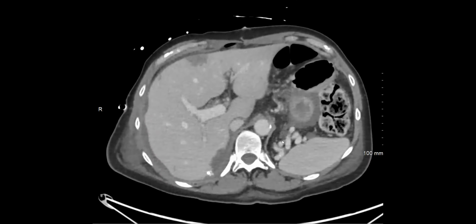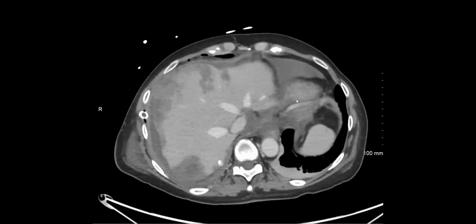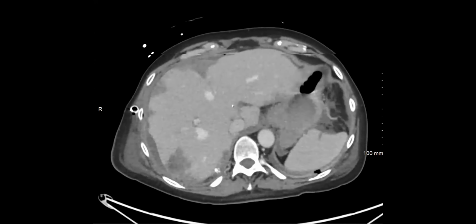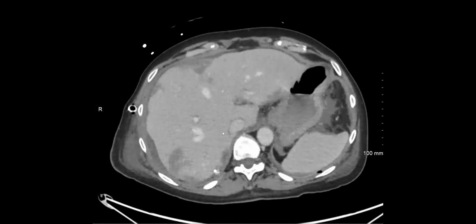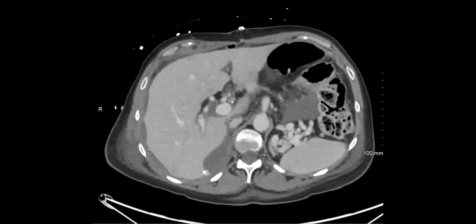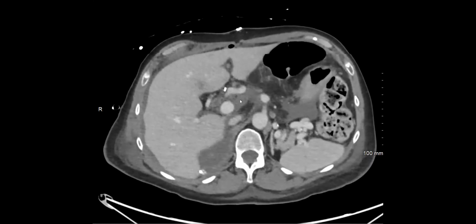So I don't know if it was just ischemia during surgery. I've never seen this extend from just ischemia during surgery. I would expect that there was some sort of embolic event happening. There's absolutely no issue with the artery. It's completely fine centrally.